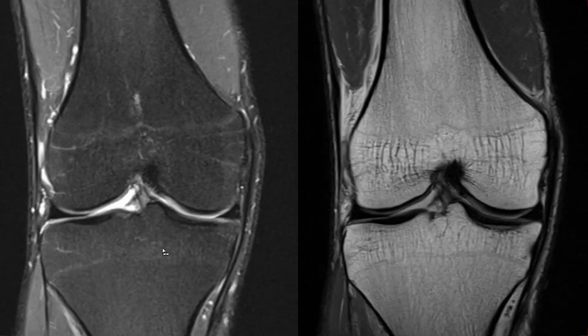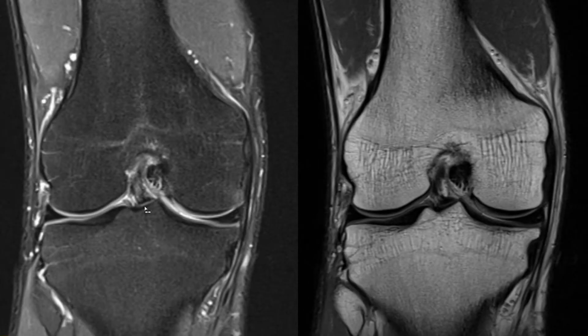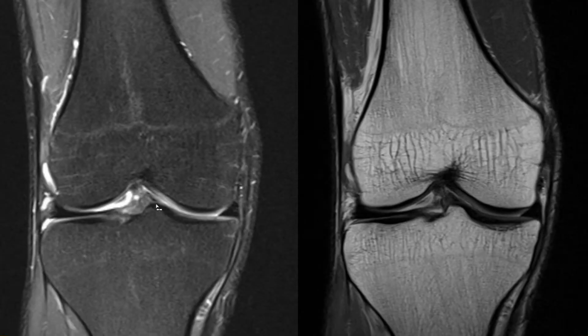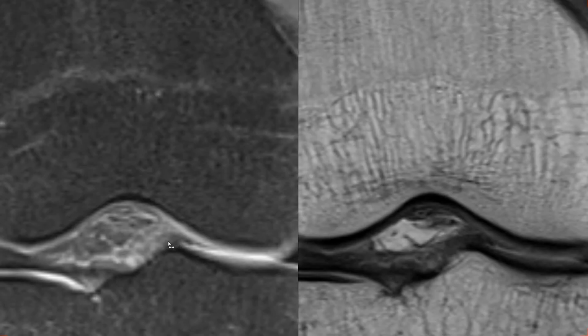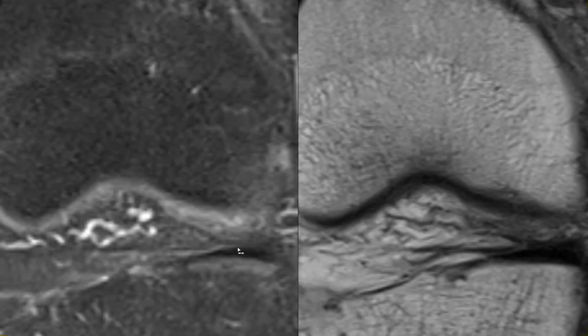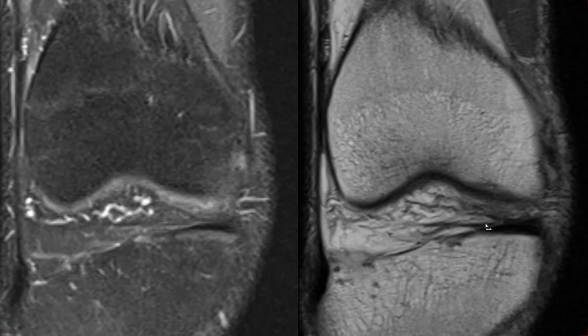So let's see whether we can actually see it, because there's one pitfall, and sometimes the posterior horn of the lateral meniscus has an insertion that's inserting here into the intercondylar eminentia, but it's not the case here. So you can still see here this dark dotted structure. There it is. Then here, this one, and then here it's inserting. So especially you can see it here, check.